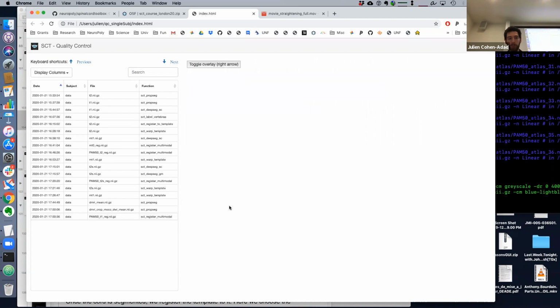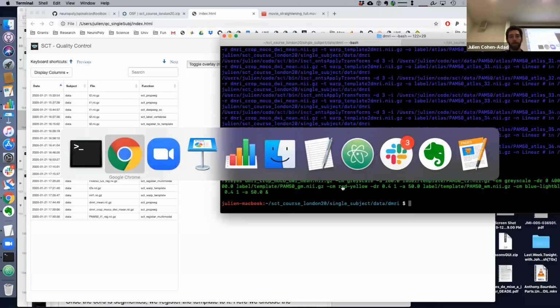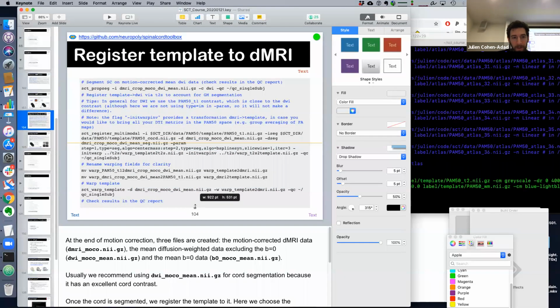Okay, so if we refresh, I didn't do any QC report here for this command. I can fix my thing here, minus QC single sub. So I'm editing the course material on the fly.